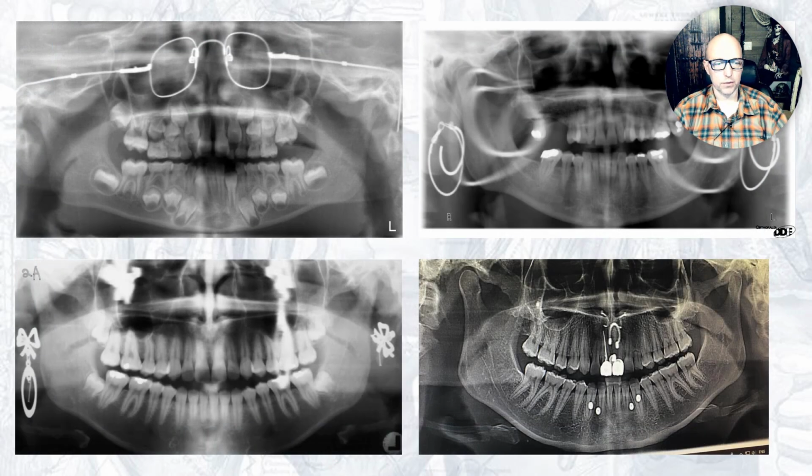Ooh, what's wrong with these ones? This is the Hall of Shame material. Take one of these and we'll have a little poster with your radiograph on it and your picture next to it saying this radiograph was taken by this student. No, we wouldn't do that, would we?